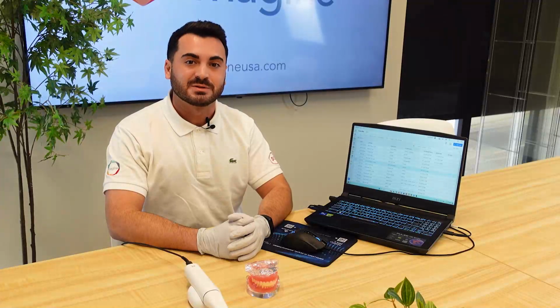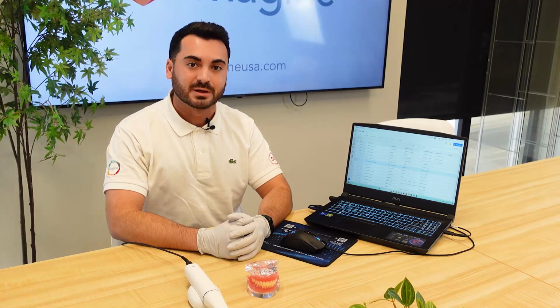Medit has various types of denture cases, such as full, replica, and implant-supported dentures. The Replica Denture feature duplicates an existing denture by scanning the outer and inner surface of the original denture. You can then take that scan and forward it off to a lab, or bring the scan into exocad to then design your own duplicate denture to manufacture.